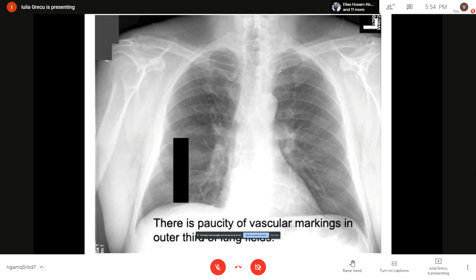Also, as they progressively divide into smaller and smaller branches towards the periphery of the lung, these vessels will become so thin that they will not make much opacity on the lung. So the periphery of the lung will appear much clearer because of the small dimension of these vessels and interstitium as they reach the periphery of the lungs.